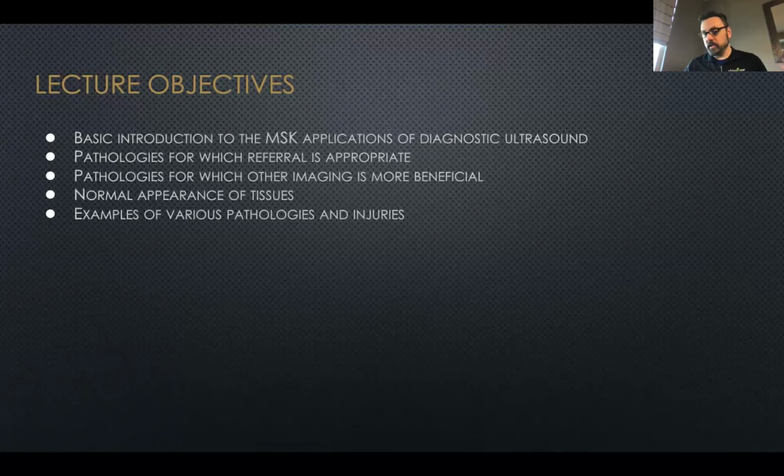And I wanted to just take this hour and run through some of the basics related to musculoskeletal ultrasound, when it's appropriate, when other imaging modalities would work, and when you are looking at an ultrasound, what are the benefits of it? What do the tissues look like? And then I'm going to share a couple cases that I had come across over the years.